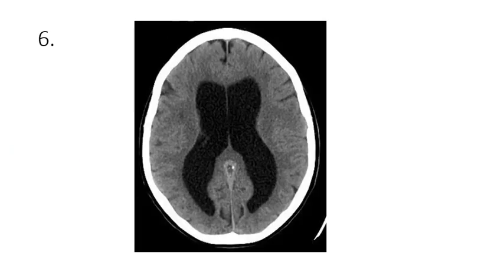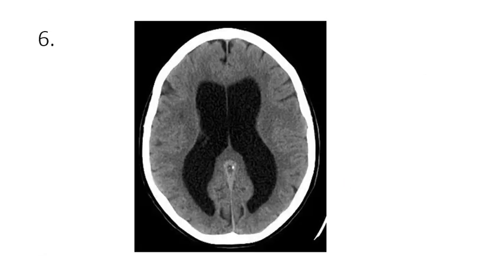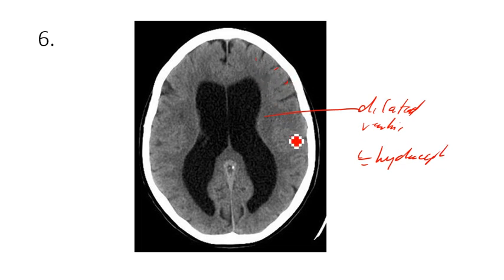Okay. Now, what are you seeing there? Obviously, you are seeing that this ventricle, and particularly the lateral ventricle, is very dilated. So a dilated ventricle is a sign of what? It is a sign of hydrocephalus. We are seeing the sulci and gyri are there, so they are fine. However, we are seeing this grossly distended lateral ventricle, that is hydrocephalus until proven otherwise.